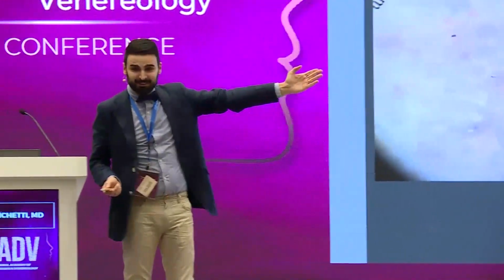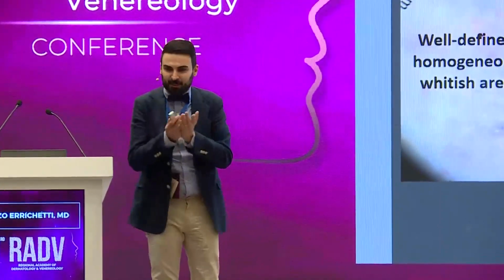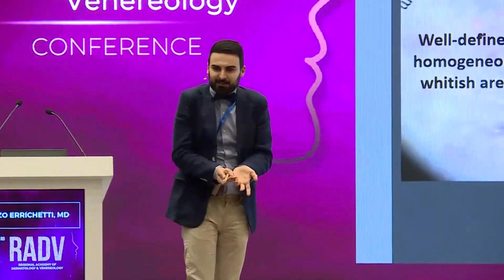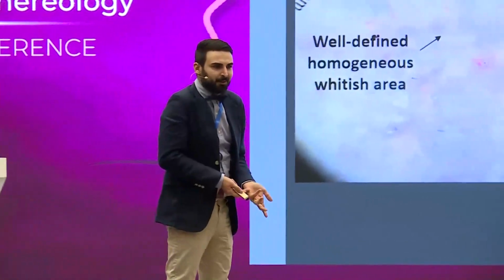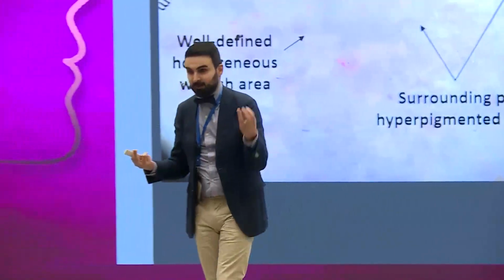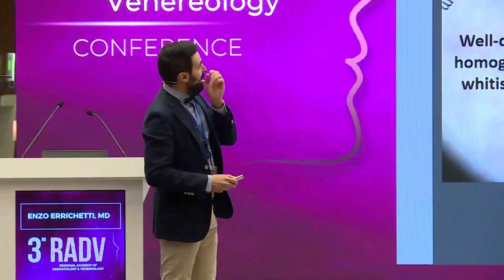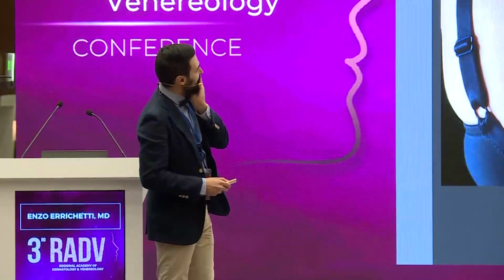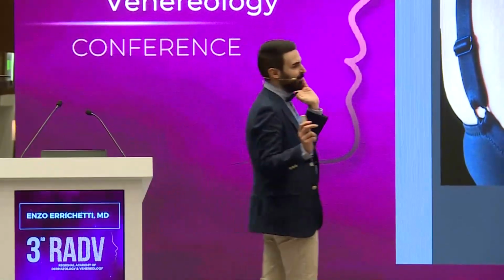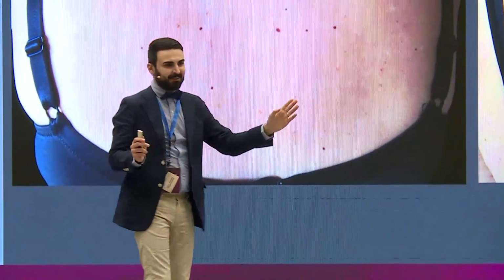And then, yeah, porokeratosis. Come on, during the winter, we don't see inflammatory lesions. We see hypopigmented lesions, okay? So we have to rely on the remaining findings. So the peripheral keratotic track with a double free edge. Great, great. Okay, here, now you have to tell me the diagnosis here. Vitiligo?